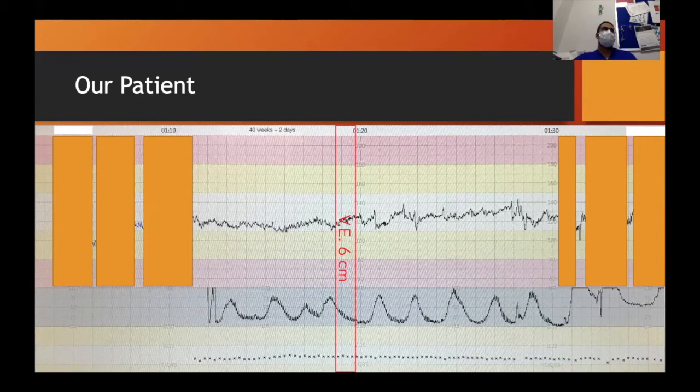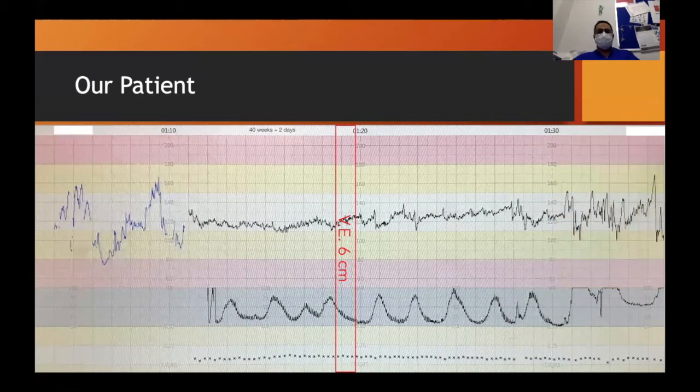Slightly lower, but she's contracting. Is being slightly lower a good sign or a bad sign? Is that a sign that baby's stressed or that baby's chilled out? Chilled out a bit more. Potentially with baby's head coming further down, that's also a normal thing. So the baseline tends to come down because there's more pressure on the baby's skull, hence the vagal nerve. Okay, so variability seems to be fine and the baby seems to be cycling. So some activity there, nothing, and then some more activity there. Okay, so we're happy with this trace?